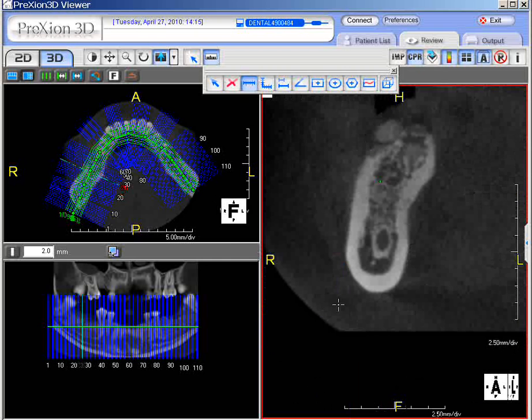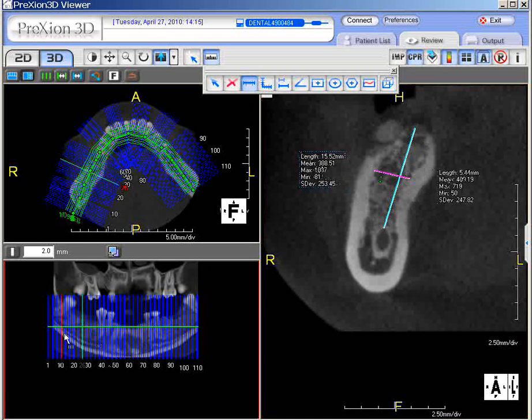Okay, and you can find what the measurement is. You can double left click it to launch it by itself, do the same thing, make it easier to see. All right, and so there you go. Now remember, as you do the math, you could back away 2 to 3 millimeters, so you can pretty much say I could put maybe a 12 or a 10 length measurement, whatever you wish to do from your clinical expertise at that point. Okay, so remember, you can also do a cross section this way. So now you know what section you can look at using the CPR function.